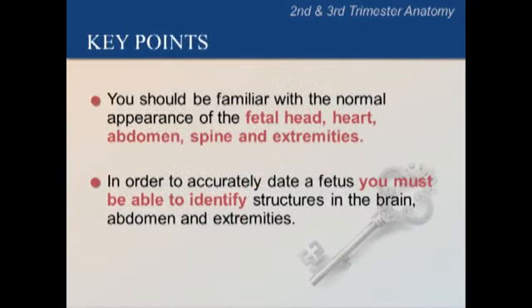Let's review some key points. You should be familiar with the normal appearance of the fetal head, heart, abdomen, spine, and extremities. In order to accurately date a fetus, you must be able to identify structures in the brain, abdomen, and extremities.